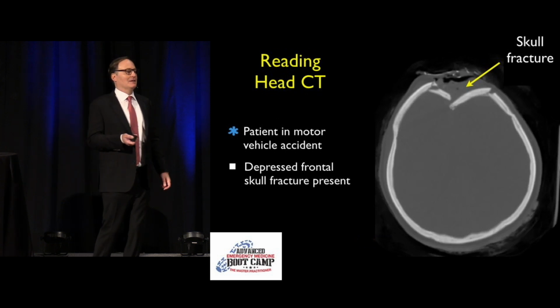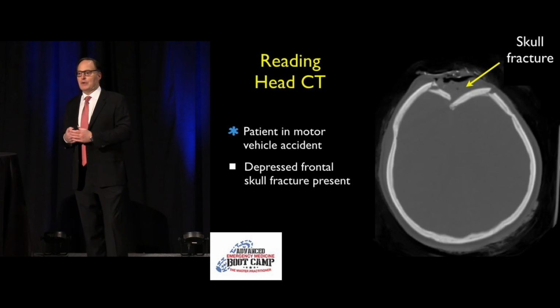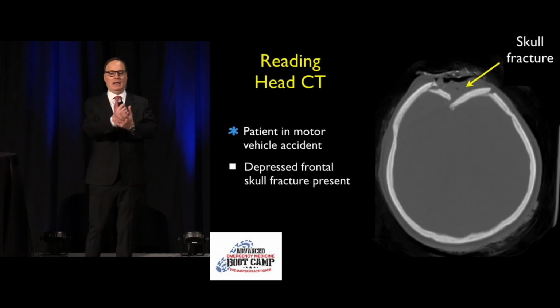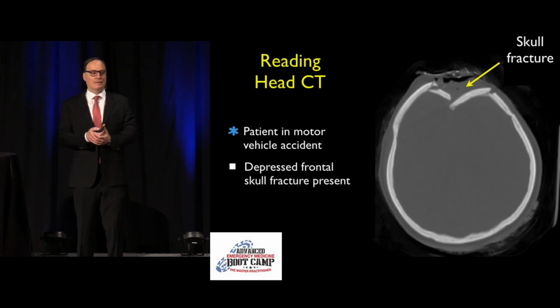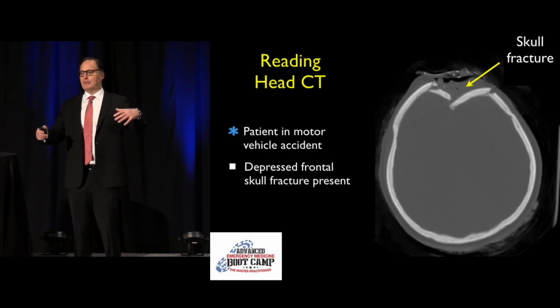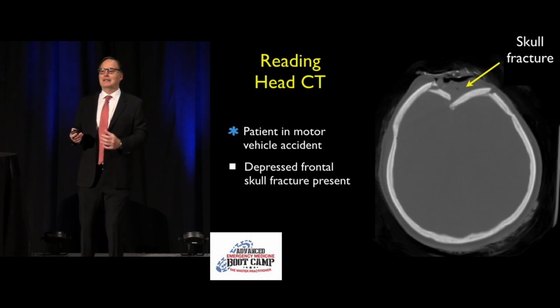How about this one? Okay, I don't think any of us would miss this. This is a patient who was not wearing their seatbelt, high-speed motor vehicle accident, thrown directly into the dash, boom, and we can see there's a depressed skull fracture. Now, where there's smoke, there's fire, and if I flip this over to the brain windows, it would not look good, and that will be coming down the pike.